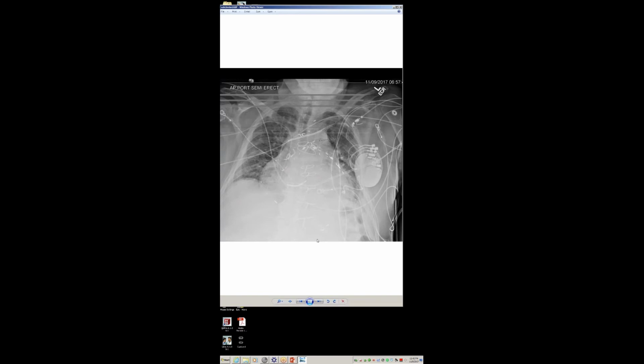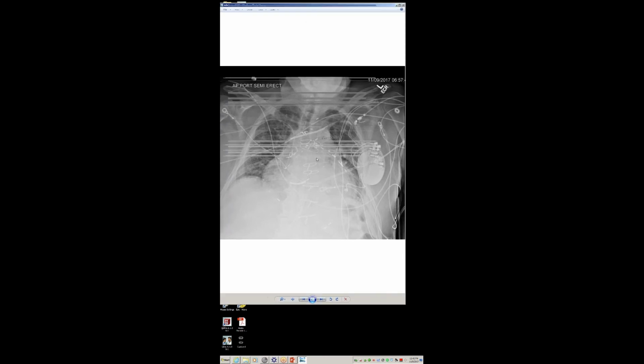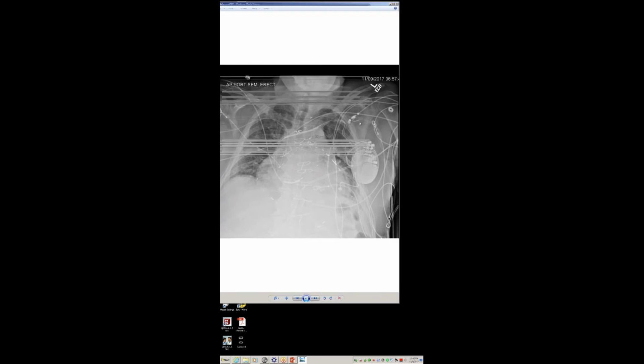I don't see the balloon pump. They told me it's well below, it's down in the belly. But I also asked them very nicely if they're going to put these in the future to please let us know that that's what it is versus an attempted venous line. It does have a little bit of a different look than most standard subclavian catheters. But I don't know if anyone else has ever seen one.